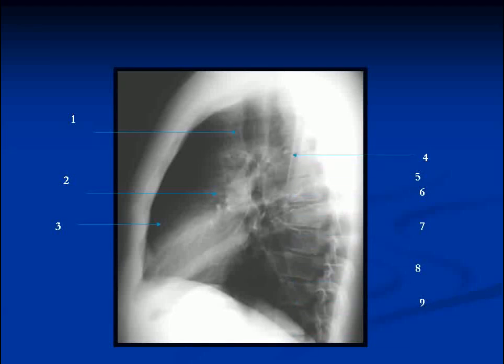This white area here is formed by the arch of the aorta, and you can make it out just very faintly, but it is a white area that can be quite distinct. This other white area here is the left pulmonary artery, and the left pulmonary artery goes up and over the bronchus here. Now this is the bronchus to the left upper lobe, which we see as a round hole end on. The pulmonary artery sits above it, and you can see the white area above that bronchus.